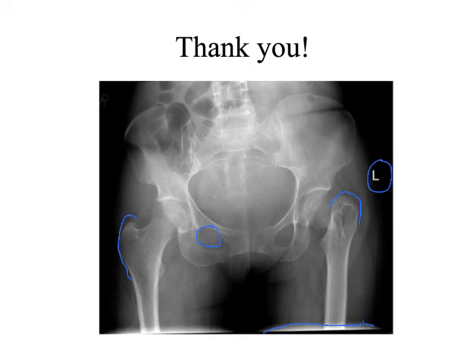I don't know if this will help or not. She's saying they're rotated. Their feet are rotated in, right, but then they're rotated to the right. I think, wouldn't it be the opposite? So when they rotate to the right, their foot is actually horizontal instead of being rotated in. That's possible. That's possible. Yeah.